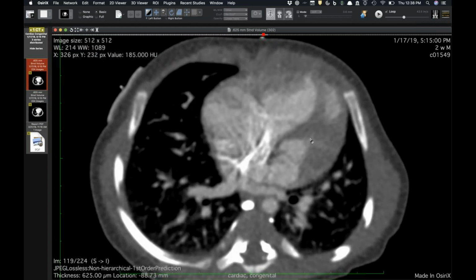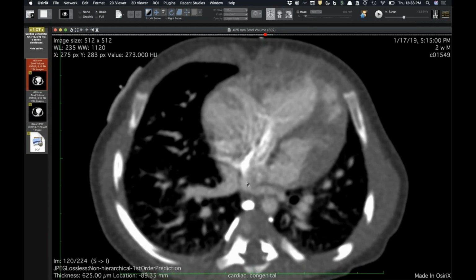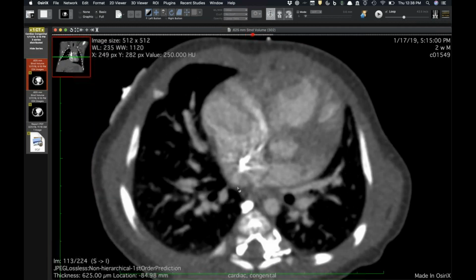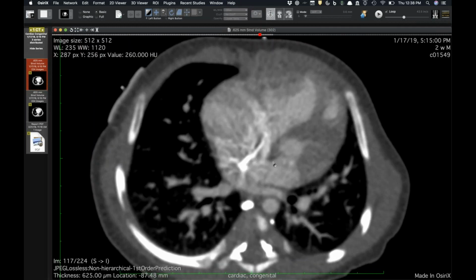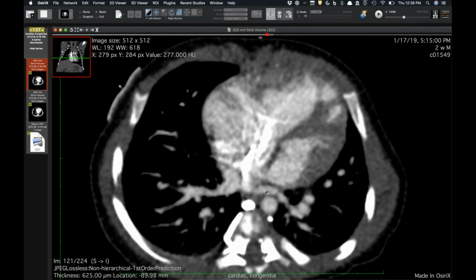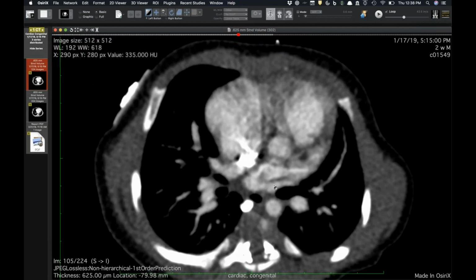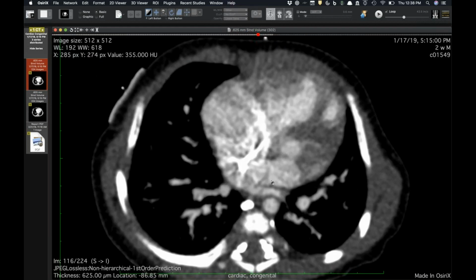And then this is really cool, because when you look at the pulmonary veins, it looks like the left side of pulmonary veins cross midline. It's almost one of these midline common ostiums that I've shown in adults. But what's interesting about this is, notice where the contrast is. This is actually the interatrial septum right here, and as the surgeon was saying, it goes all the way up to the roof of the left atrium. And so all of the pulmonary veins actually insert to the right of the septum.